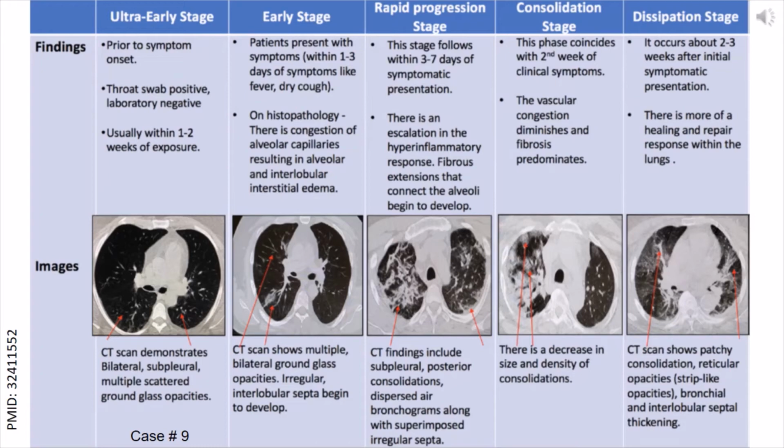Case 9. Chest CT has greater sensitivity as compared to RT-PCR in diagnosing COVID-19, but it lacks specificity. There has been a lot of debate on using a CT scan as the front-line screening tool for diagnosing COVID-19. In fact, CT findings begin to appear even before a positive COVID-19 lab result. The characteristic CT scan findings evolve in 5 different phases, as shown in the figure.